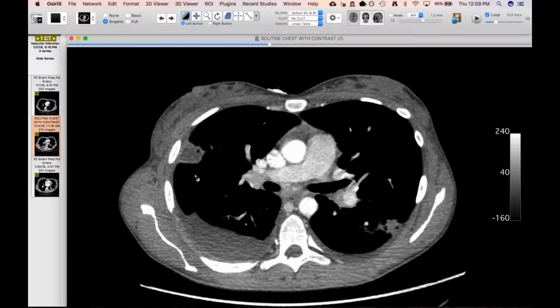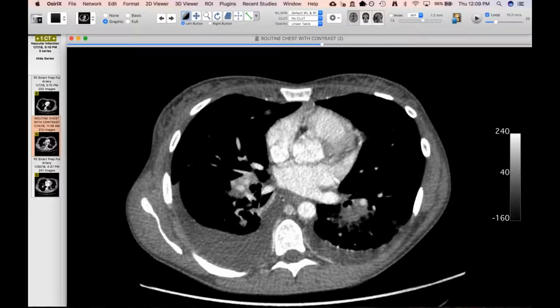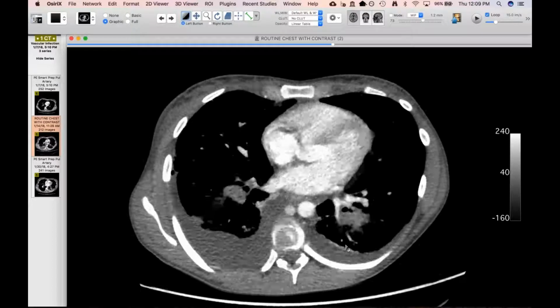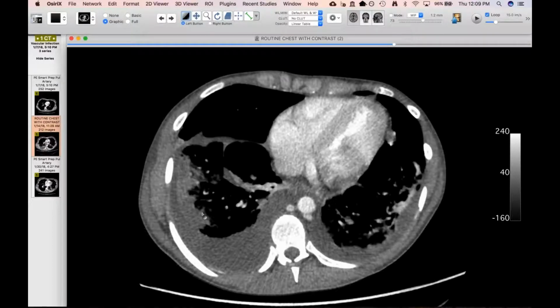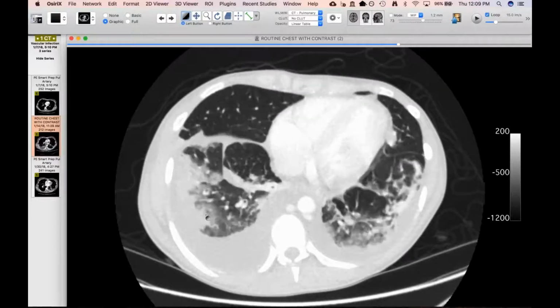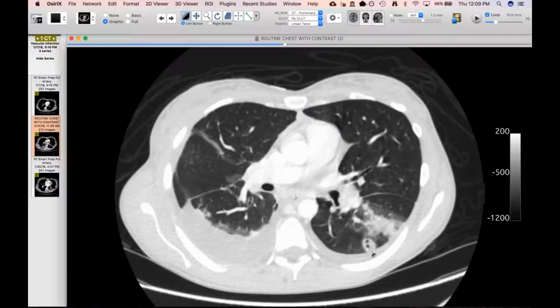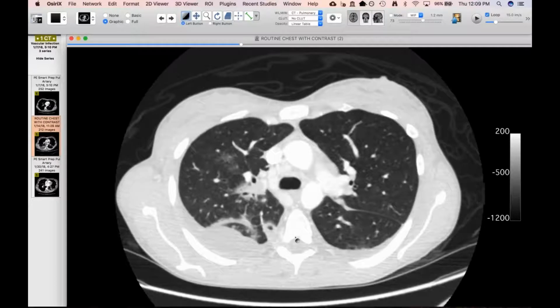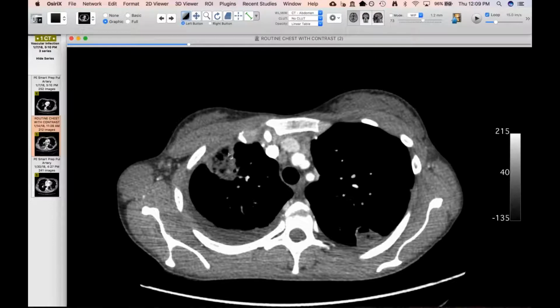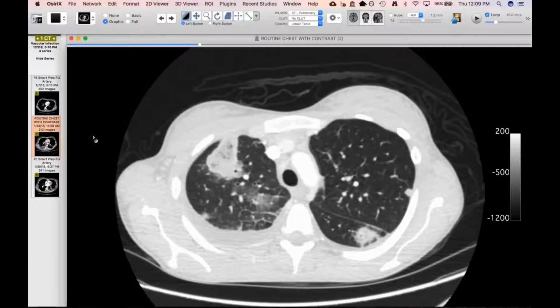So she was an inpatient this entire time. And as you can see, this is 7 days later. And now she has large macroscopic emboli in both her right lower lobe and left lower lobe, with still evolving peripheral areas of infarction. And how much of this is superinfected, how much of it is bland hemorrhagic infarction, I'm not sure. I mean, clearly that looks like a septic embolus here too. And then these in the upper lobes, again, a nice look of a peripheral infarct with that central ground glass, largely absence of air bronchograms, and then the peripheral higher attenuation.